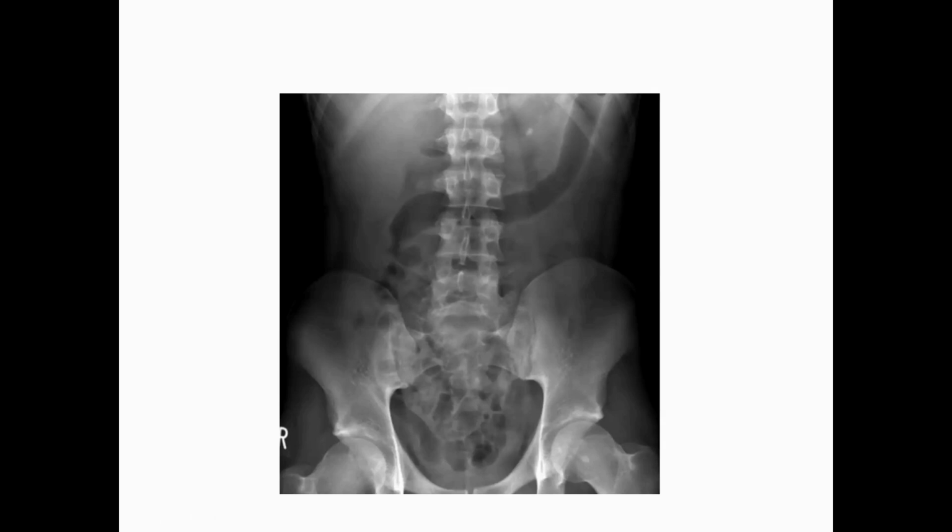You can say there is a loss of the normal haustral markings. You know that the large intestine should contain incomplete mucosal folds, the haustra. But here, can you see the haustra? No. Why? Because there is a loss of the normal haustra of the large bowel, since it has gone through a huge inflammatory process of the colon.